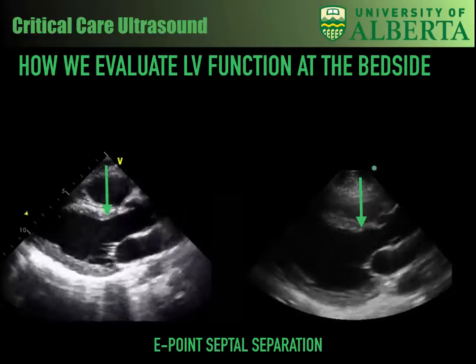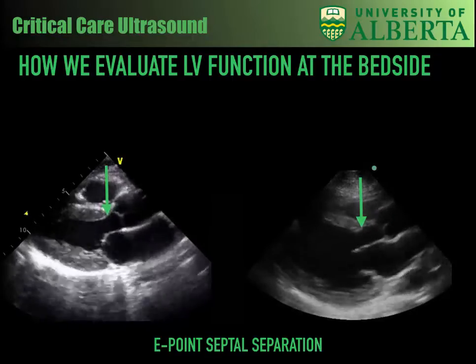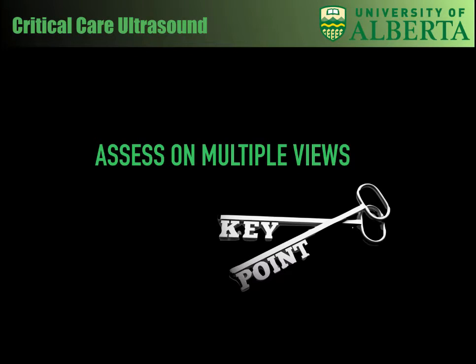In this case, this was due to a reduced cardiac output and also likely some morphological changes in the left ventricle. So I can't emphasize enough, it is important to assess on multiple views to make sure you confirm any hypotheses about the left ventricular function.